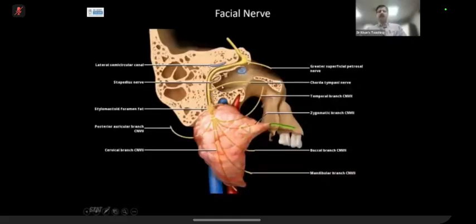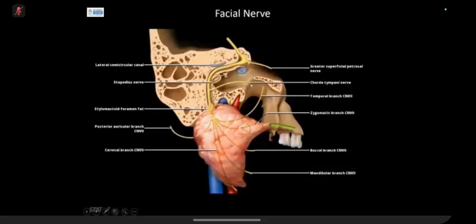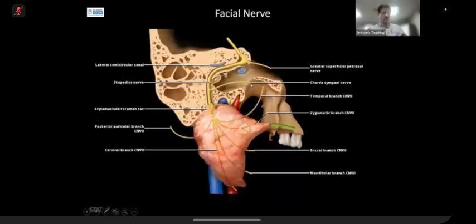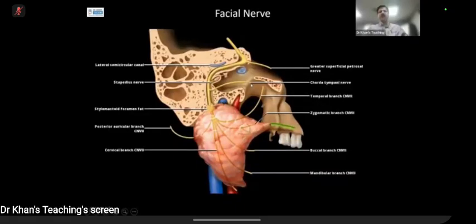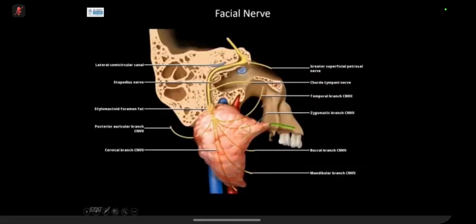There is another nerve here, which is known as chorda tympani, which on a CT scan you can see on a sagittal sequence. It comes out and passes through. Chorda tympani supplies what? Chorda tympani, what do you know about it? So it's the tongue. Yeah, good. Posterior 2/3 of the tongue. Anterior. It supplies anterior 2/3 of the tongue.